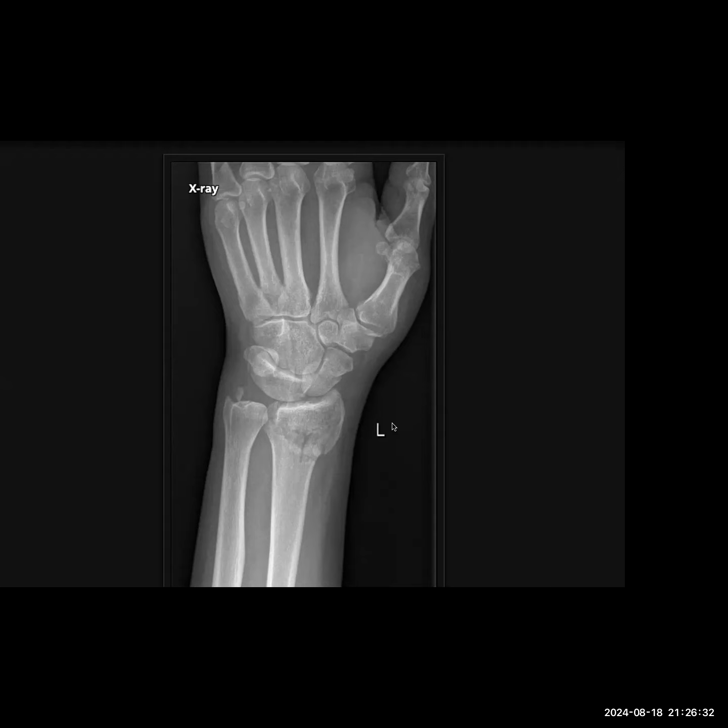So sometimes you get the satisfaction of search and then you tend to miss out the other findings. More often than not, these are very asymptomatic things, but sometimes a patient can present with a constant wrist pain, right?